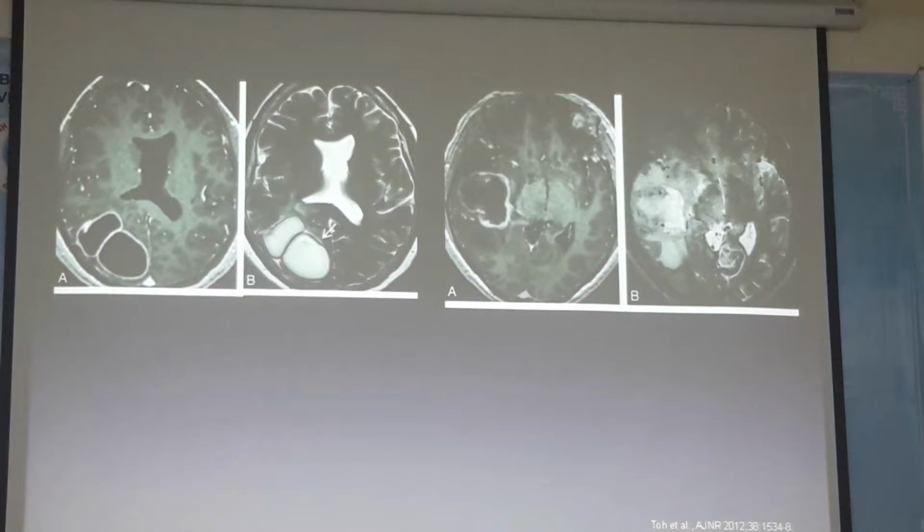And so if we look at T2 imaging does show a difference between these two abnormalities. On the T2, there is not really too much edema, and we do see a rim here, whereas on T2, with the necrotic tumor, there's quite a bit of abnormality within the brain, but we can see this same kind of edema from an abscess under certain circumstances, so that alone could not necessarily tell us the difference.